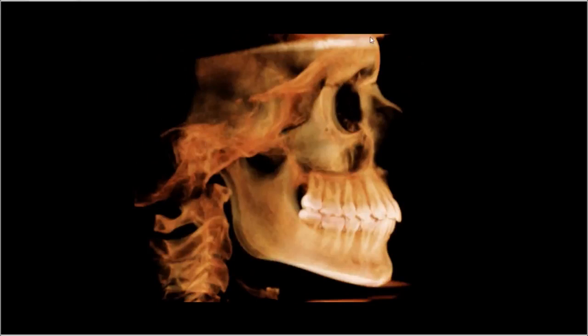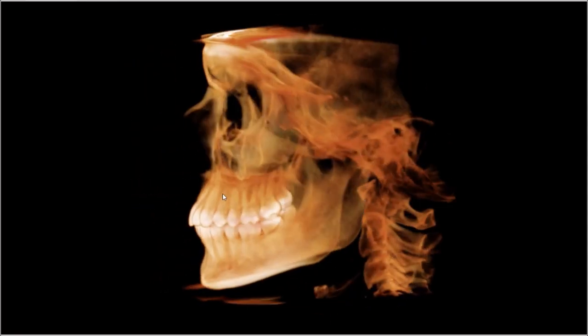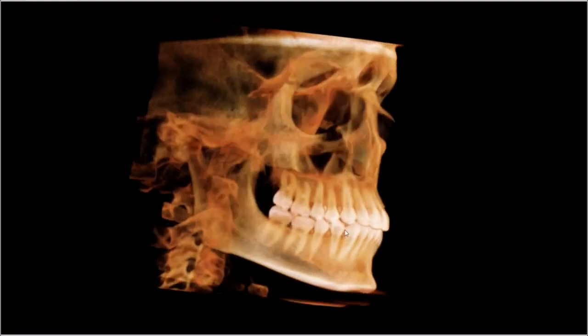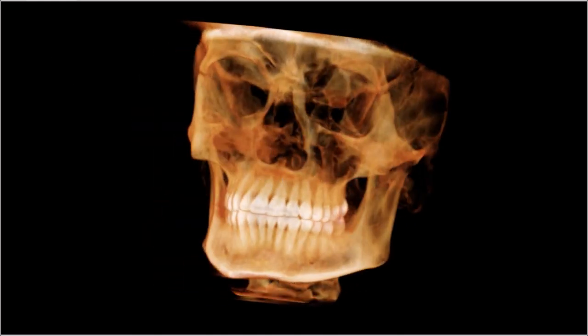But you do see up into the frontal sinus, and you see a large part of the skull base. A lot of different parts of anatomy you can see in this field of view outside of just the dentition and the immediately surrounding bone. So we'll look through this. You'll notice something right away, and then we'll talk a little bit about anatomy.